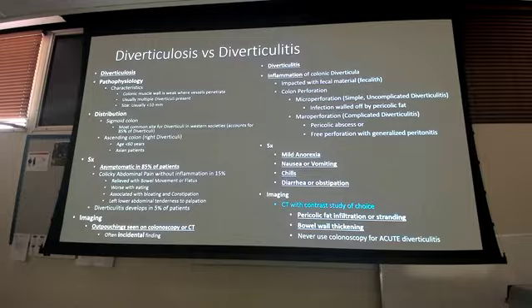You see the outpouchings. CT with contrast is your study of choice to truly evaluate it when you're looking for the itis. You need the CT with contrast to look for the diverticulitis, because what you're looking for is that fat stranding, that inflammation, that thing we just talked about in the darker gray area, the highlights, the more radiopaque lines, that inflammation and fat stranding. That's what you're looking for to help diagnose diverticulitis. You can't see that on x-ray. If you continue to get the barium enema on the x-rays for the initial study, you're just going to see the outpouching. You're not going to see the inflammation. So that's why CT with contrast is your study of choice.